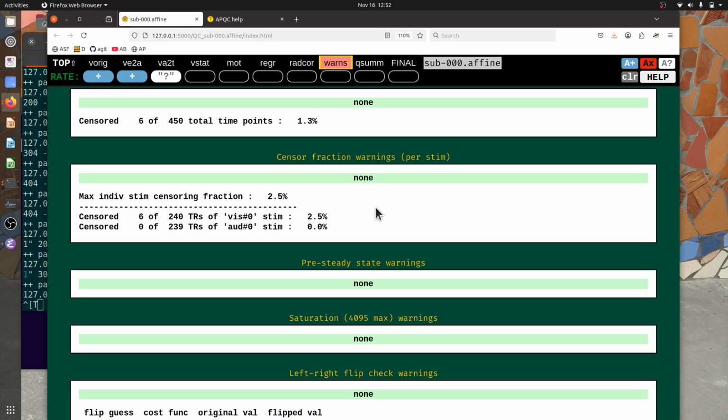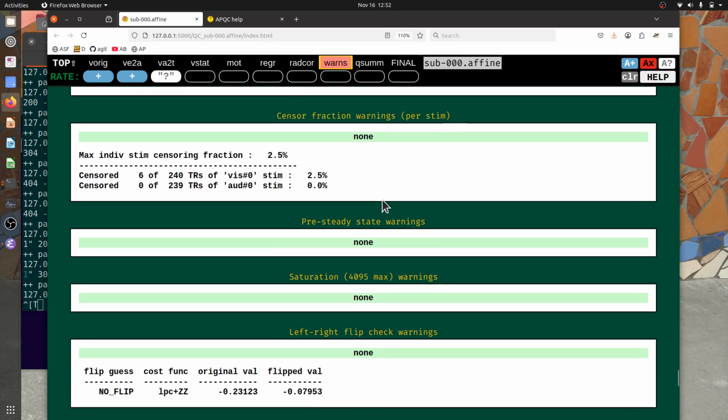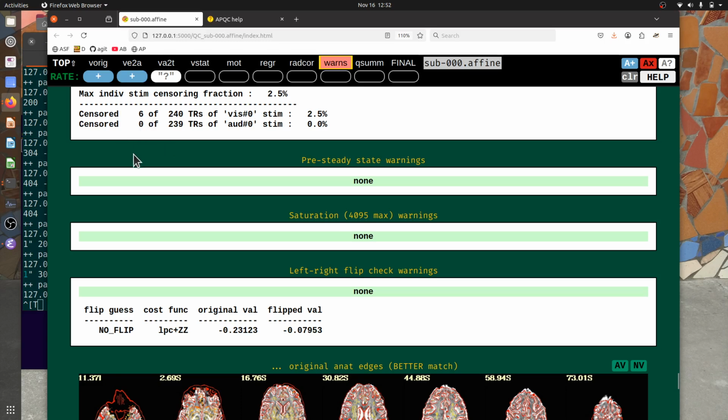But you also might need to reconsider your study design overall, because maybe the stimulus class or the way you're presenting the data or having the participant perform it is inducing motion, which really cycles into a lot of problems. And so again, this would be something you would want to catch during the pilot part of your study, rather than having collected all your subjects. Okay, but that's not really worrisome here.